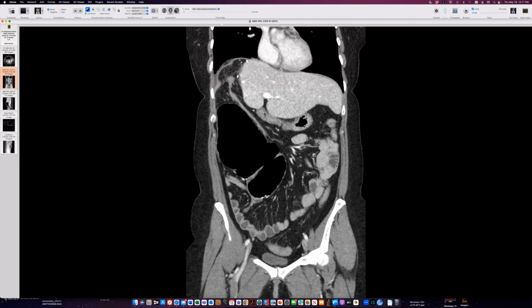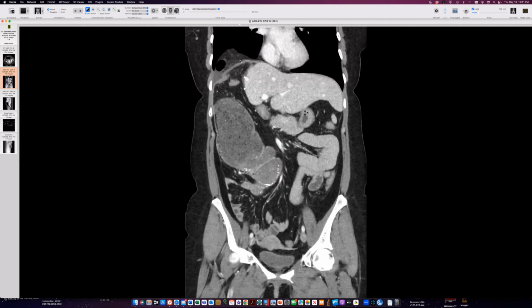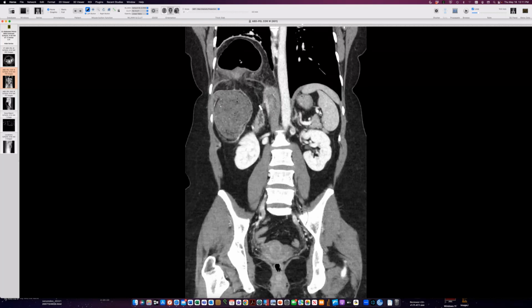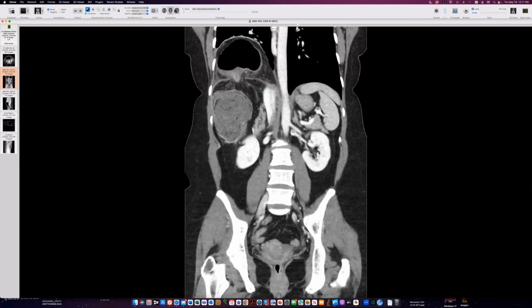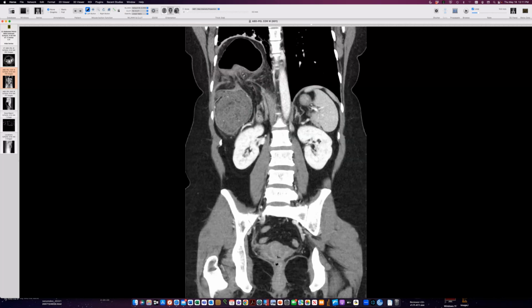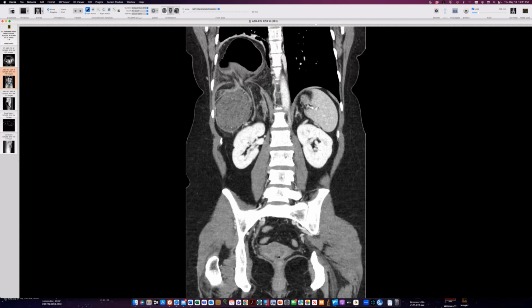And if they nicked the diaphragm just a little bit, then abdominal pressure is ultimately going to force this fat, which is very plastic and compliant, through this defect, and colon could get in there, and then once it's in there, it could obstruct, as in this case. So this person had a serious complication of volunteering to be a partial liver donor.